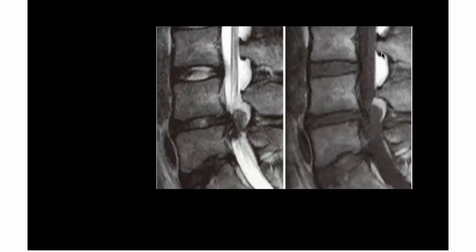Can you see something here? What is this? Epidural fat. Where is this, anterior or posterior? Posterior. So what is happening here? The epidural space is getting compressed. Yes. This extruded material is such a big extrusion that it has gone to the posterior epidural space.